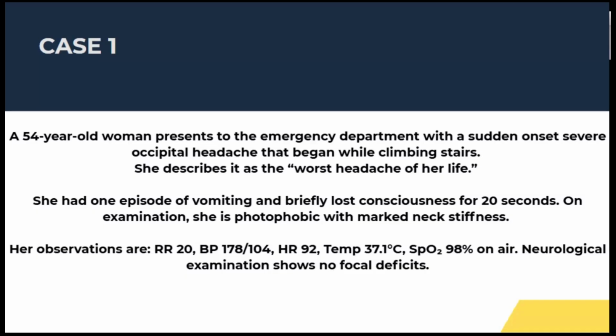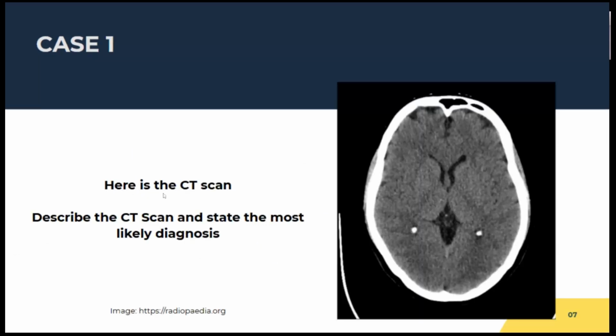So the first question is, we've got our CT scan. Can someone either with your mic or on the chat describe the CT scan and state what our most likely diagnosis is?